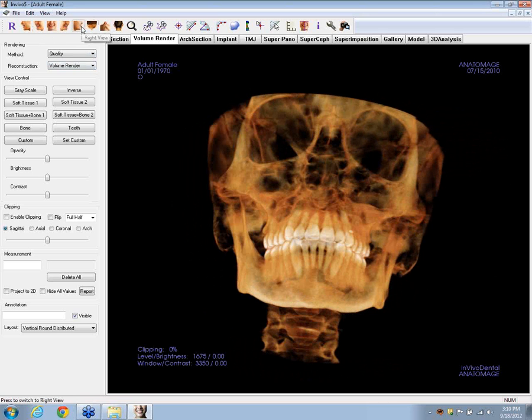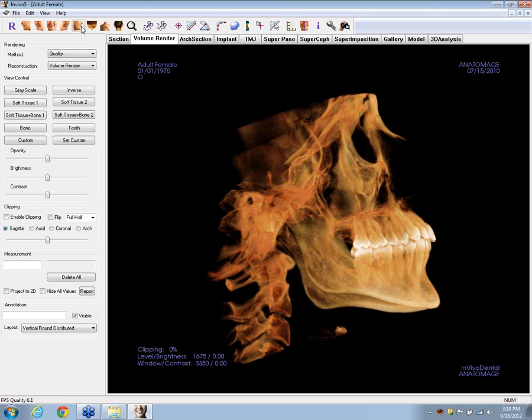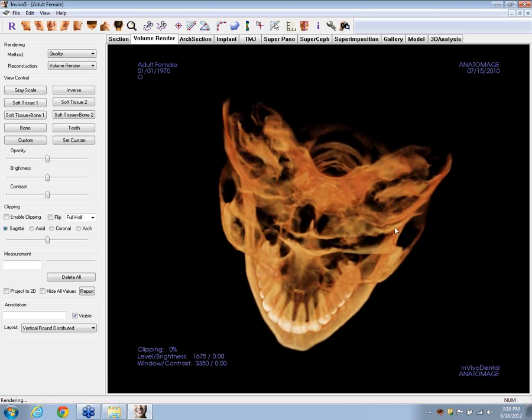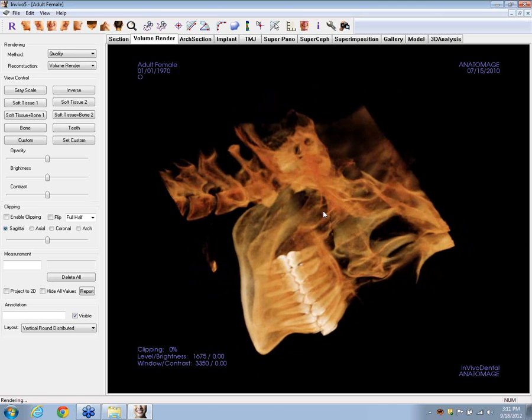This will allow us to come back to the same perspective over and over if you're trying to get a certain view for a surgical procedure, or a certain view of a certain aspect of an anatomical feature that you want to be able to come back to and duplicate after you've gone ahead and looked at other aspects of it or sculpted or trimmed stuff away.